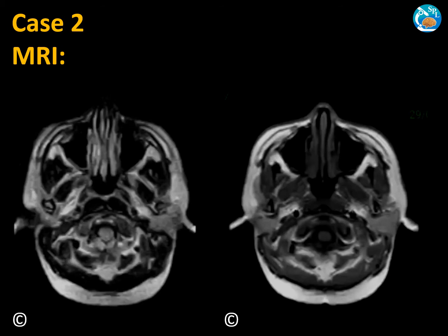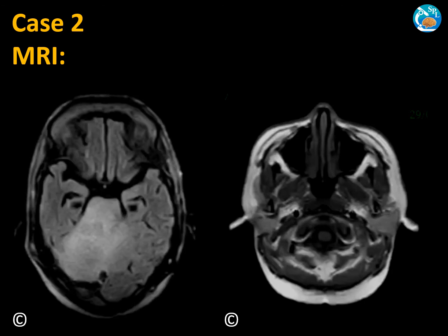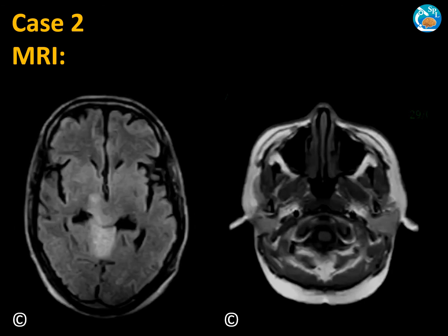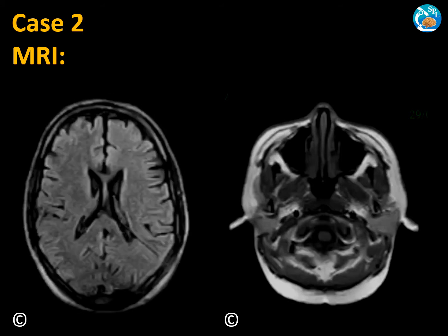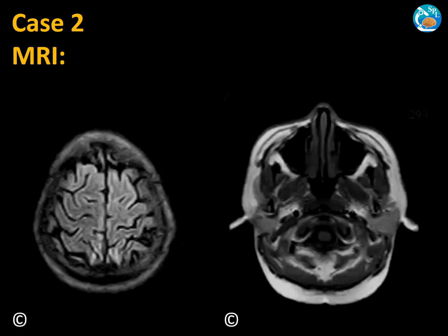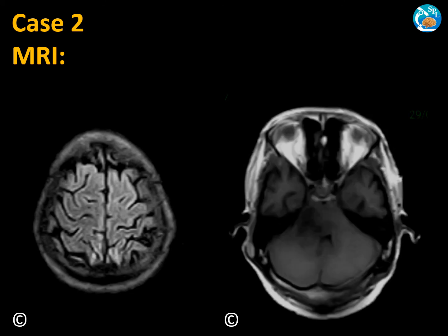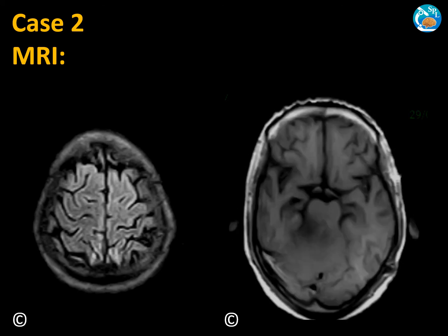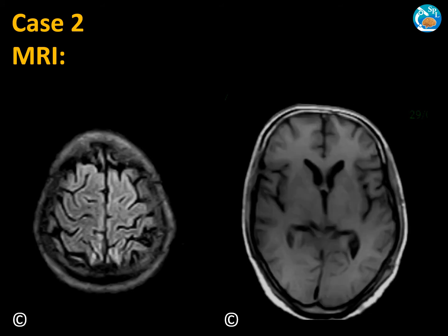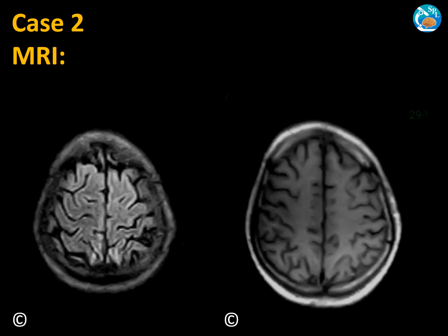His MRI revealed ill-defined T2 FLAIR hyperintense signal intensities over the right CP angle involving the right anterior cerebellar lobes, right lateral aspect of the pons, right cerebral peduncle, and extending over a small focal area of the right thalamus and left anterior cerebellar lobes surrounding the fourth ventricle and the vermis, showing few areas of FLAIR hypointensities and subtle restriction on DWI sequences.